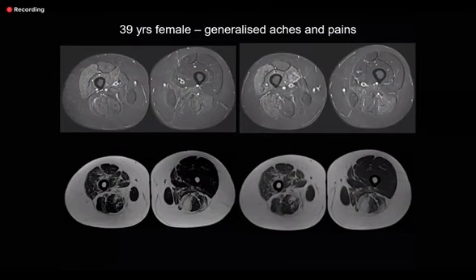Given that the patient is coming from the rheumatology clinic, I'm thinking of global systemic illnesses, which may be giving this appearance. This patient could have, I'm not sure about this, a lupus type of picture or sarcoidosis. I think more lupus and dermatomyositis are my two main differentials.